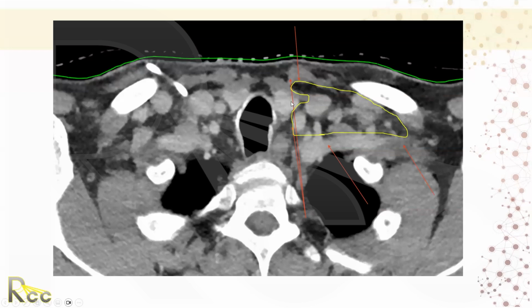So it's just to be mindful of the thyroid gland to make sure you're covering the space behind the sternocleidomastoid muscle and covering the carotid artery. Posteriorly here, following just above the blood vessels, the major trunks, whether it's the brachiocephalic or subclavian. And then laterally, this is where you can have a lot of variability because there's some room for interpretation here. Some people may stop right here, some may go a little further, and there's some variability there. This drawing here on both sides, just an example here.